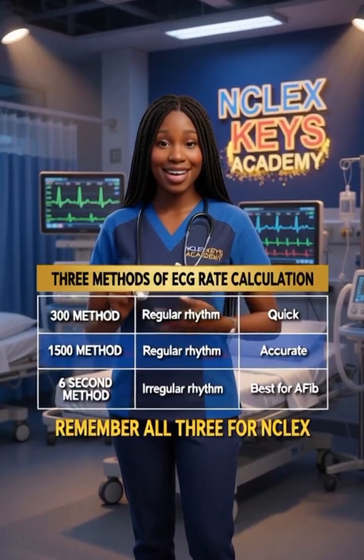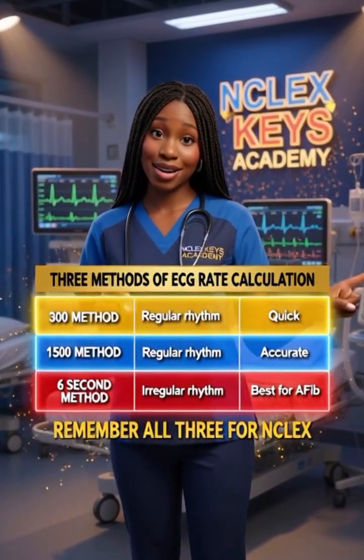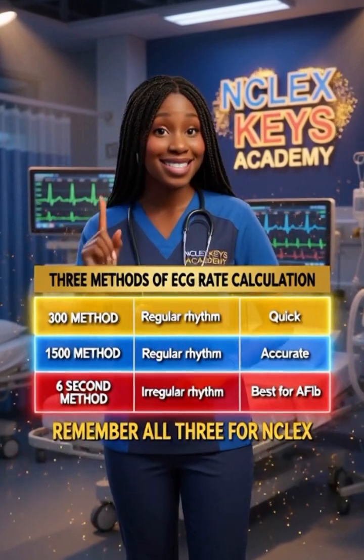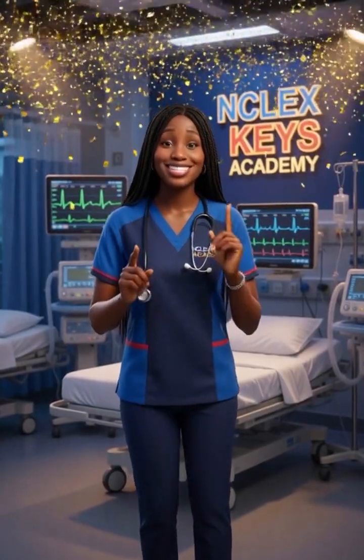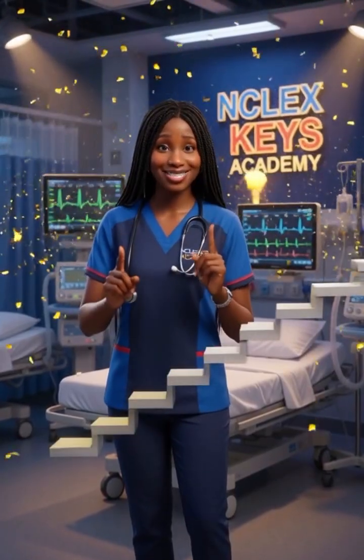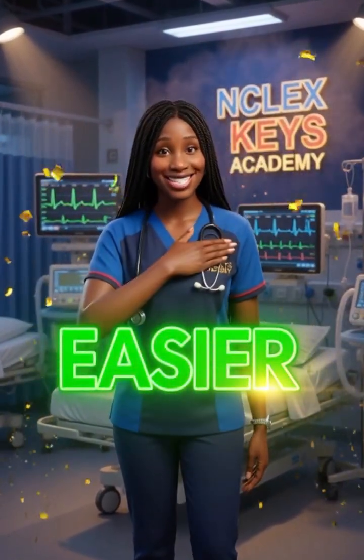So remember, there are 3 methods to calculate heart rate. Use the 300 method for regular rhythms. Use the 1500 method when you want more accuracy. Use the 6-second method for irregular rhythms. And always interpret ECG in a step-by-step systematic way. Once you understand the basics, ECG interpretation becomes much easier.